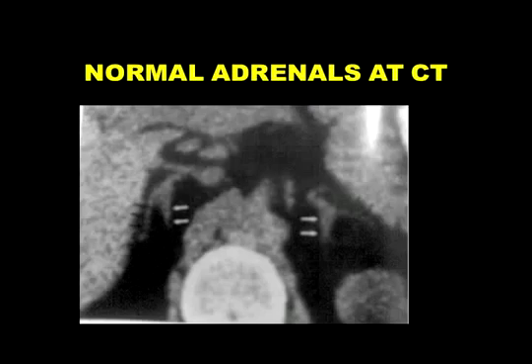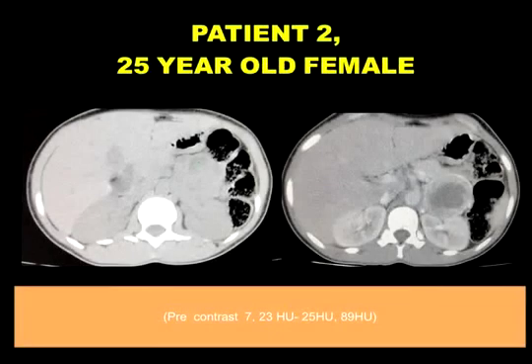So the same patient had a CT scan done, pre-contrast, then they did a post and a delayed phase. So to the right is a well circumscribed heterodense mass. You see it has that central area of hypodense or central area of necrosis, and then it has the solid area in the left suprarenal area.